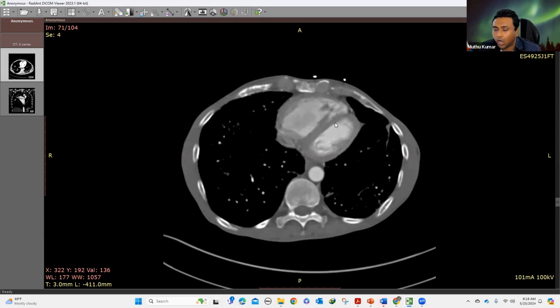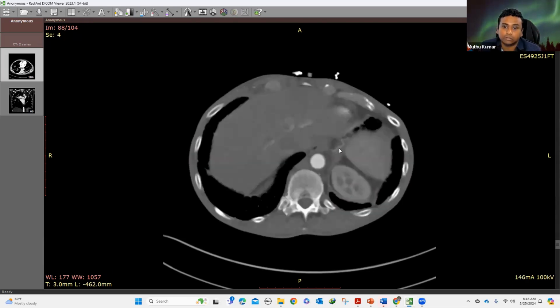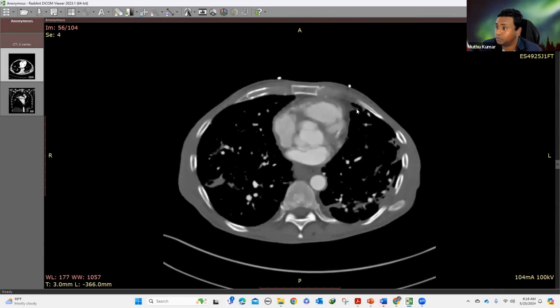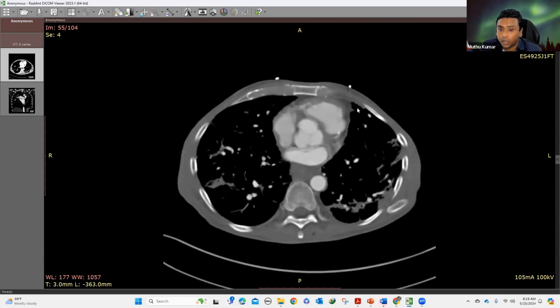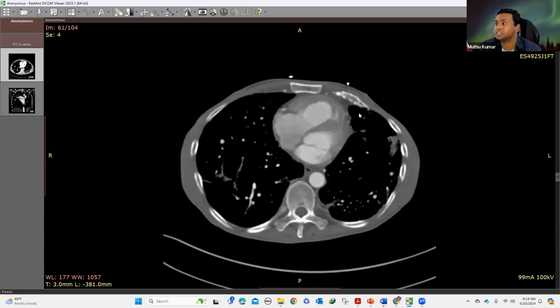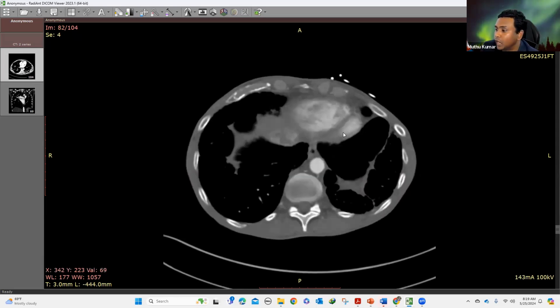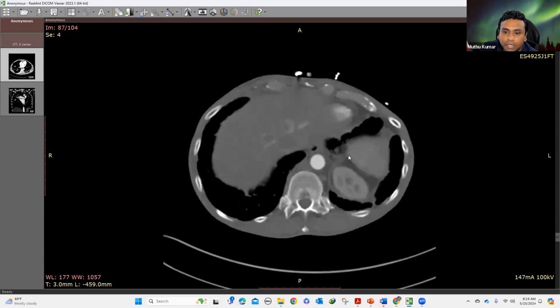By looking at all the findings, you are giving the diagnosis of fibrotic sarcoidosis with bronchial artery hypertrophy, and also giving a sign of pulmonary hypertension with RV overload. This implies the patient needs to be hemodynamically managed, with urgent cardiology referral, because this can cause acute heart failure as well. So always be vigilant of it.